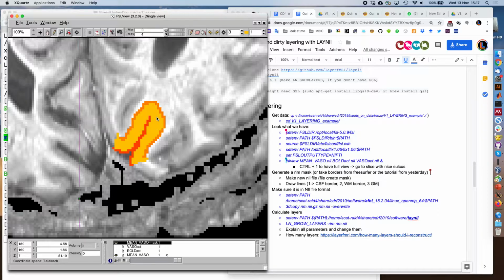Ah, you know what? You chose different masks. This is a different file. It was never closed. Okay. So now we can redo it. So now you just need to draw the 1s, right, and then we can do it.